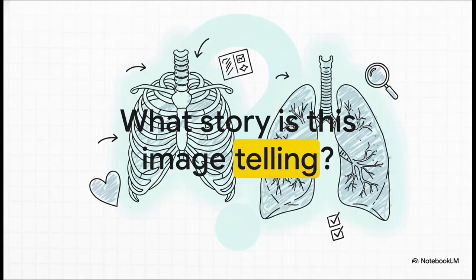So, take a good look at this. This is a pretty standard chest X-ray. And right now, it might seem like a random jumble, but it's actually speaking a very specific language. The trick to understanding that language? Well, you first have to learn what a normal story looks like.